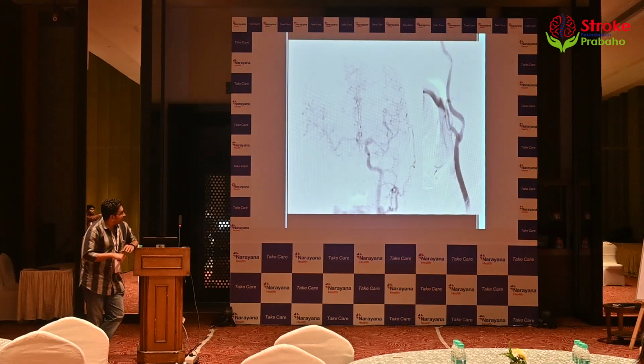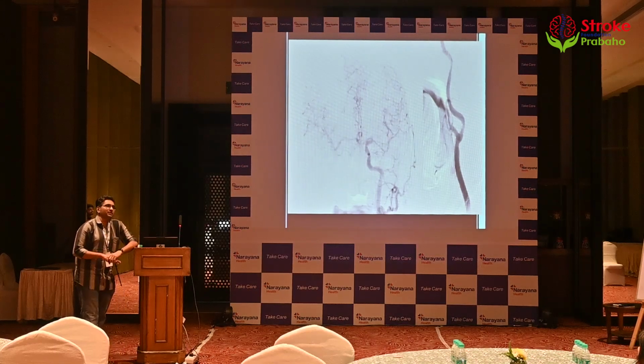So intracranially, the left carotid has about a 40% block, let's say, on the opposite side. Is there thrombus on that? No. But these are single shots. They told me it's just around 40-50% plaque, stable. Nothing on the DSA looks dangerous on the left side.